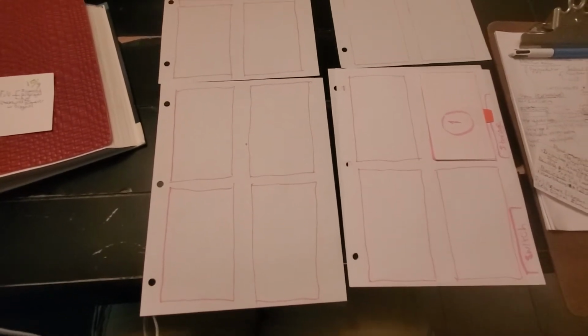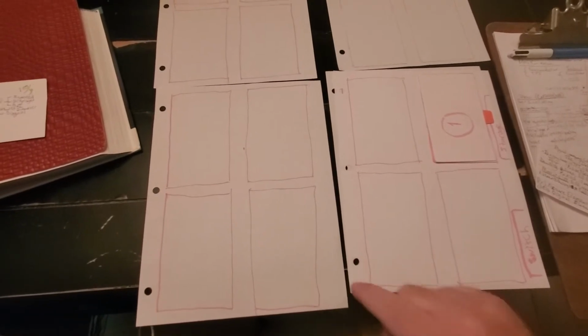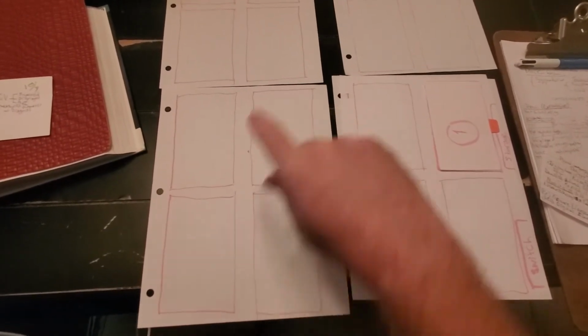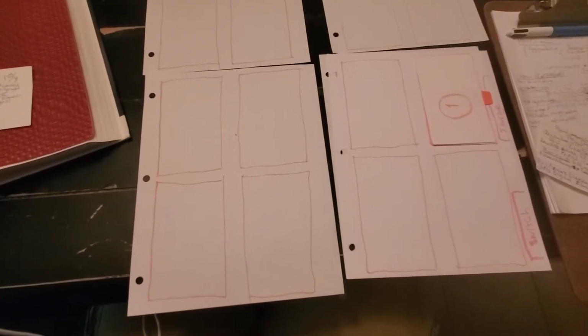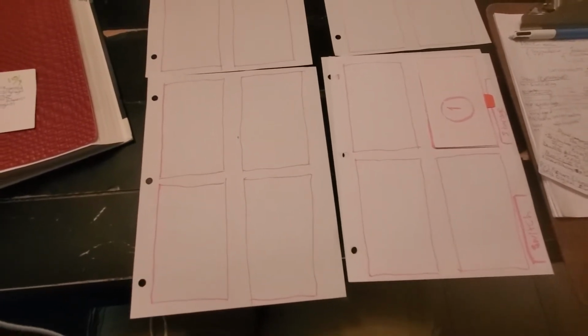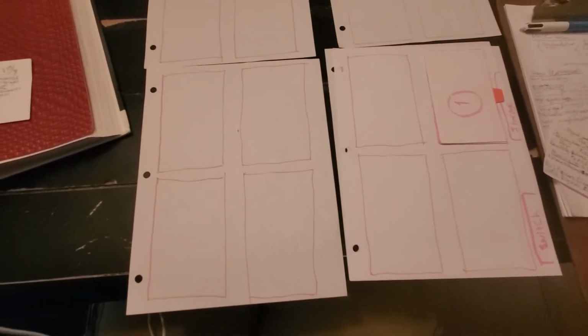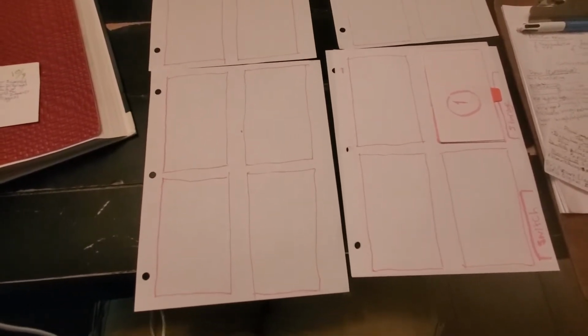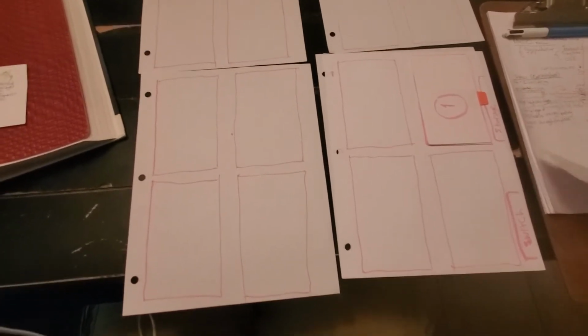You can't see what's outside the cassette, or outside the image receptor. So that's why a field of view is never going to be able to exceed the size of the matrix. But the matrix size can be slightly larger than a field of view, if that makes sense.